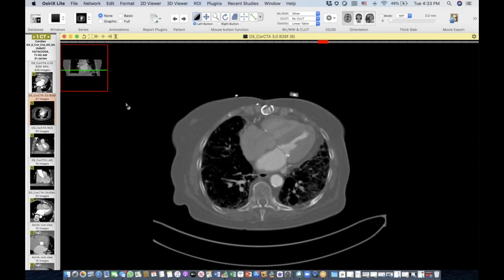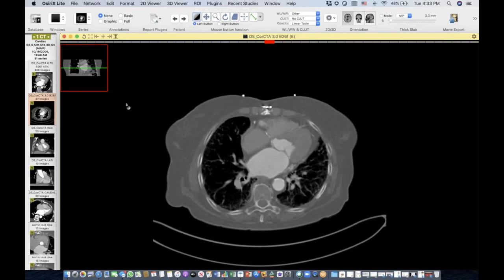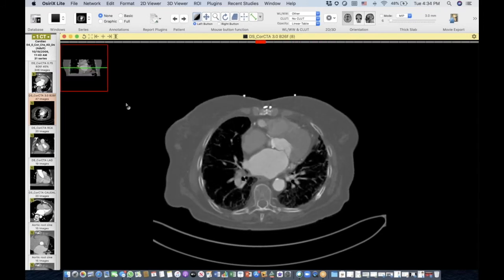This is a somewhat systolic phase, so it looks like the ventricle may be a bit thickened. It may be, but again, it's on the systolic part of the cycle. So does anything catch anybody's attention?